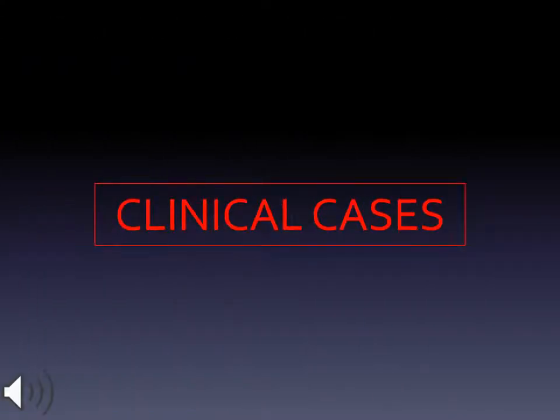Now we shall examine some clinical cases as examples of the use of the MR in the pre- and post-operative period of the ulnar nerve compression at the elbow surgery.